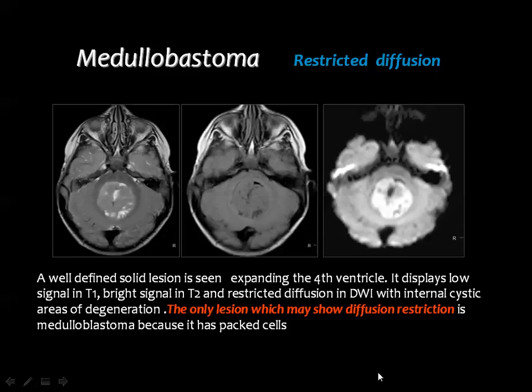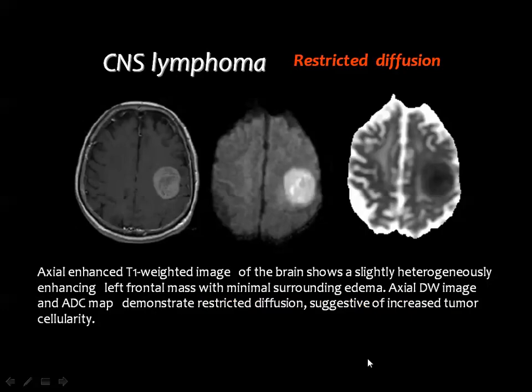And it is said in the literature that medulloblastoma is the only lesion which shows diffusion restriction in the posterior fossa tumors.